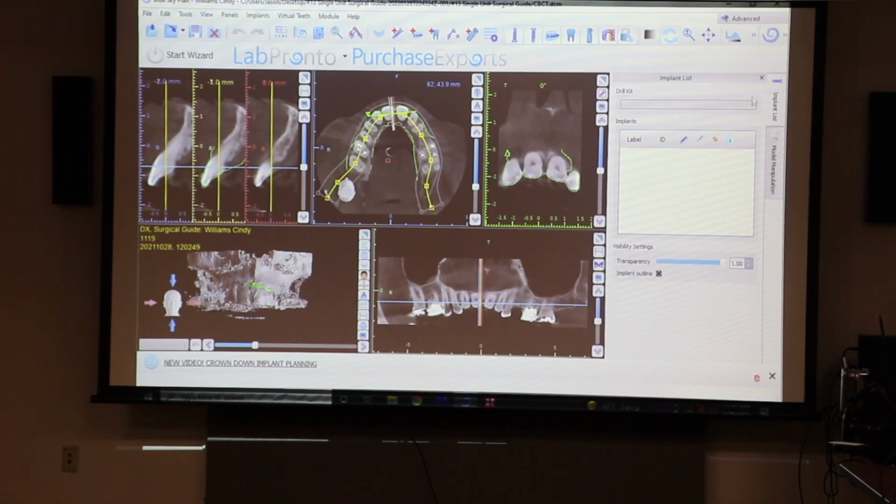How do we verify the alignment? This is how I do it. The first thing I do is I take this slider and I look at this green line in relationship to the teeth as I slide this up and down. And you can see that green line follows the cusp tips right along the crowns. You guys follow that? That green line is the outline of the STL.